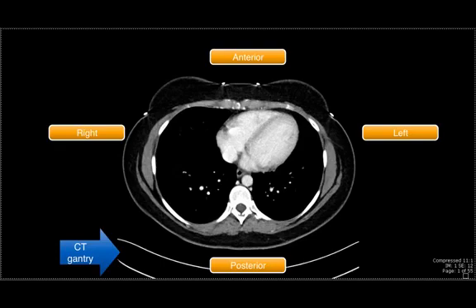Firstly, most abdominal CT scans, including the one shown here, are performed at about 70 seconds after giving intravenous contrast. But it's important to appreciate that sometimes we image earlier if we're interested in the arteries, and sometimes a little bit later if we're interested in certain specific pathology.